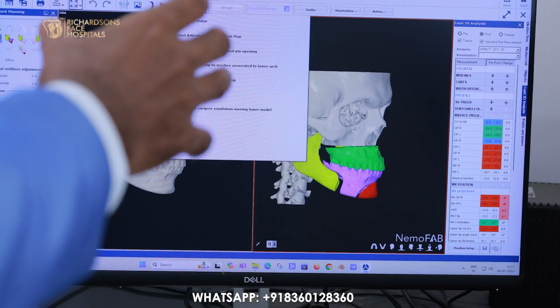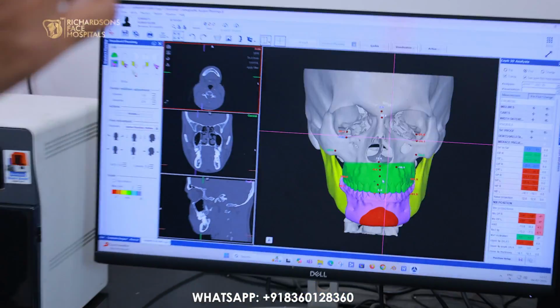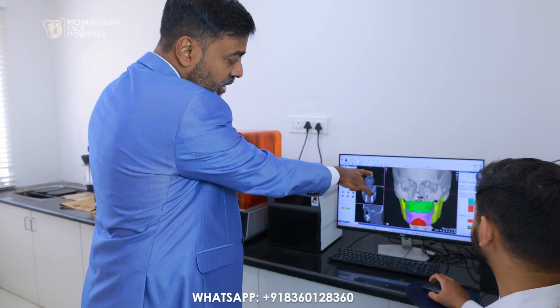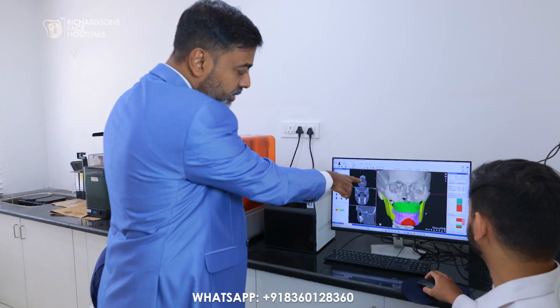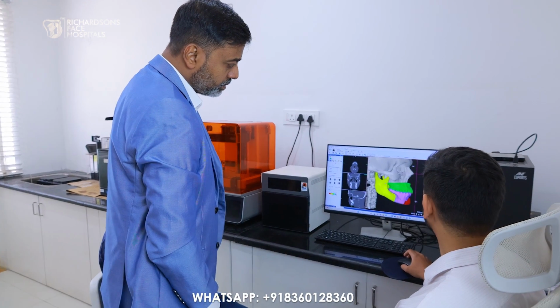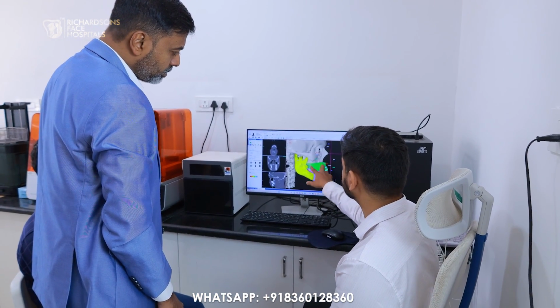Basically what he's trying to say is it's so precise that you can measure every tenth of a millimeter or even finer, and you can see all the points he's now gotten there. You want to tell them what those points are, the red dots? Yes, sir. These are the points, and the values indicate the amount of changes that have occurred.